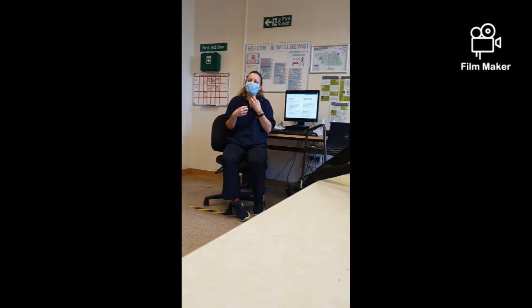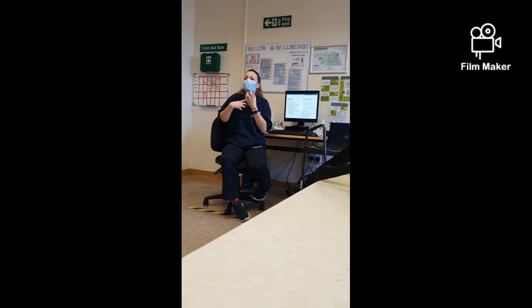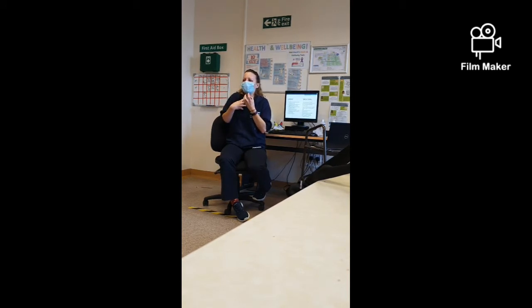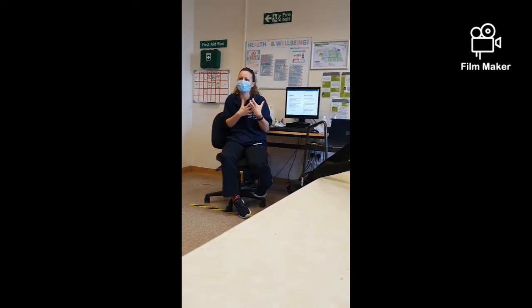If you've got atelectasis, if you've got collapse, so say we then have a collapse on this side, because that top lung has collapsed, and it's because we breathe with negative pressure, as that collapses, it pulls the trachea over to it. So if you've got a deviated trachea, you need to look for whether there's a collapse and it's pulled that trachea over, or whether there's air trapped and it's pushing the trachea to the other side.